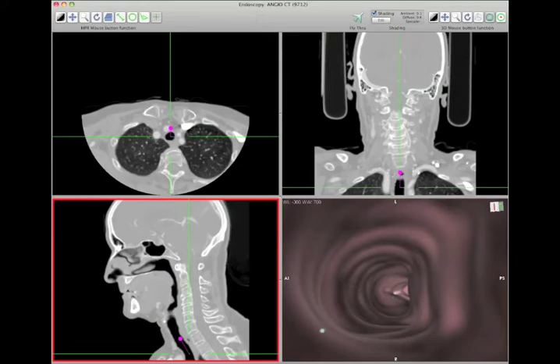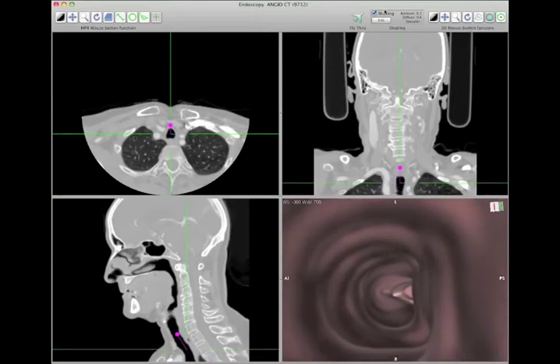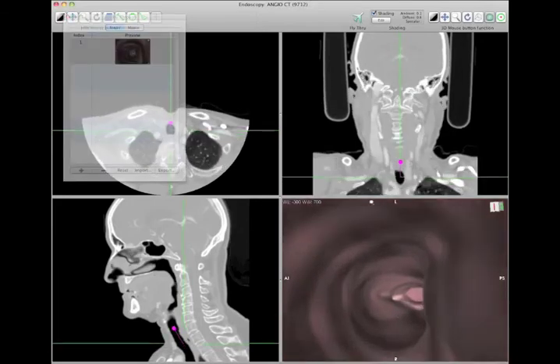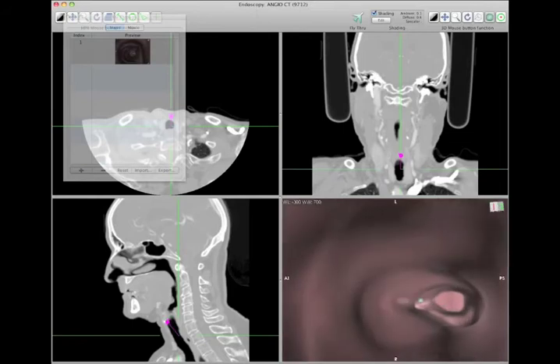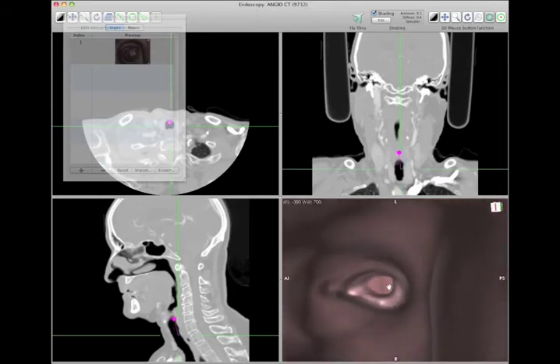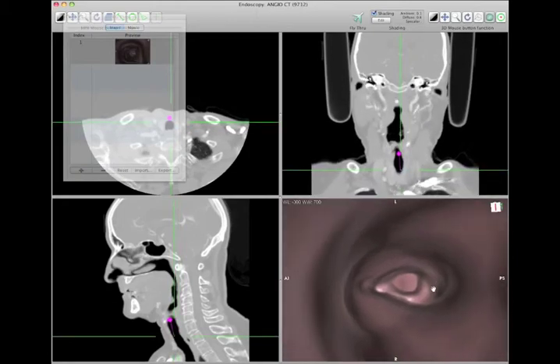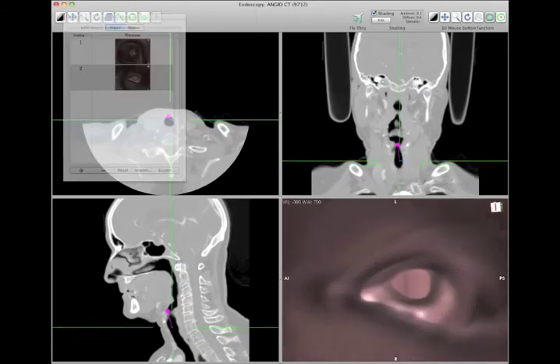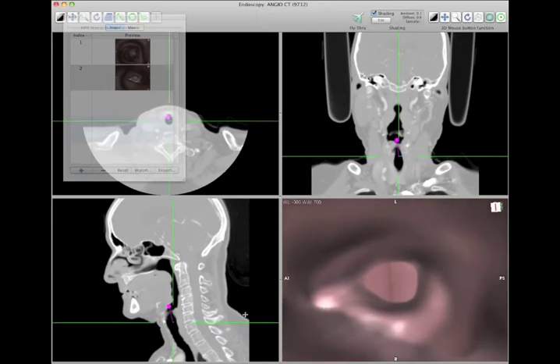If you make a movie, this is the one that's going to be rendered. And the way you make a movie, I'll show you this, is you would do fly through, click a keyframe, change your zoom. You can position your camera 2 ways. One is to click and drag, which is a pan function, and the other is to click command to get the hand tool, and then you can move your camera left and right. And you can set a keyframe. This isn't the best one. There's another data set which has lungs in it, which might be more interesting for you to do.